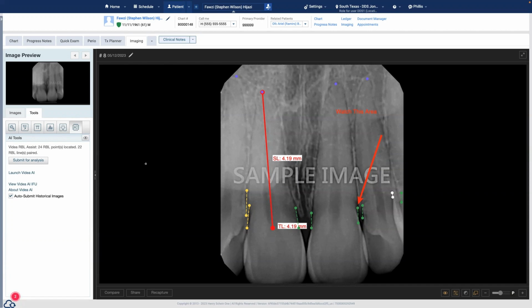The great thing about Dentrix Ascend is we can just turn it on in your account. And then your x-rays start to have your AI detections on them. So it's really simple. It's not something that requires a lot of training time. You continue to do everything you're doing, and we add this information for you.